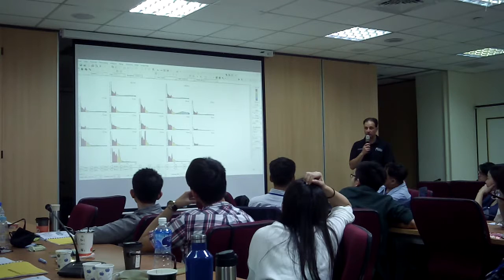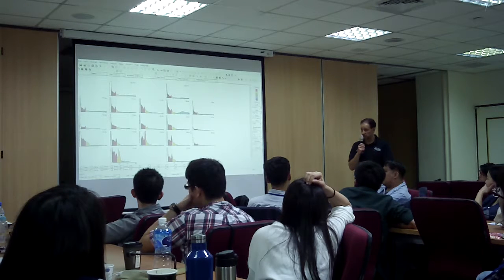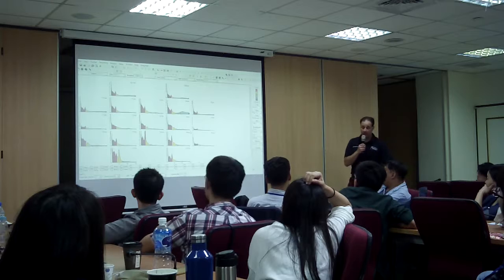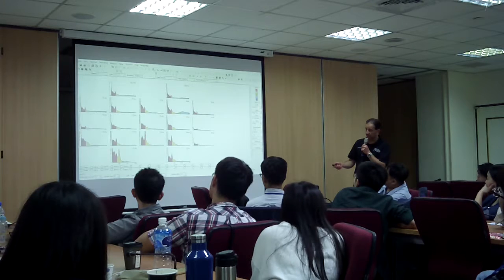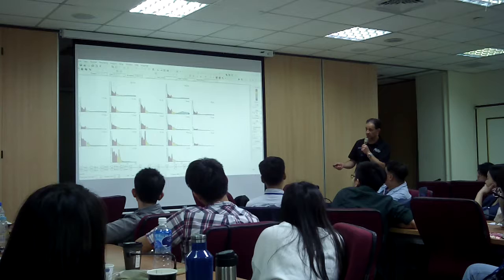The peak alpha frequency. Okay? It was at 7.32. So that has serious academic consequences. Okay? So, aside from the epileptic discharge, aside from the slowing here, we need to take care of that brainwave activity.